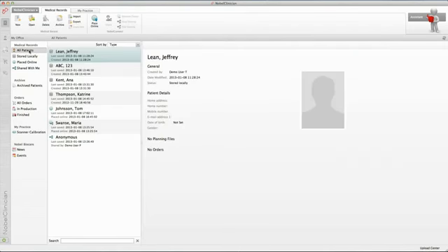From the home page, you may select to start with a new patient file or to open an existing patient file. If you haven't created a patient file before, the patient list on your screen will still be empty. Press New in the left upper corner to start a new patient file. How to create a treatment plan for a new patient is explained in detail in the section Complete Planning Process.